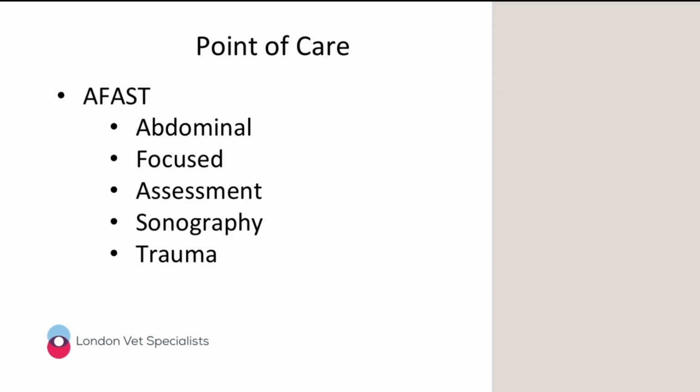So all of you in first opinion practice will be familiar with the AFAST examination, which stands for Abdominal Focused Assessment with Sonography for Trauma. This is an examination predominantly to look for fluid, and if there is fluid present, to try and make a decision as to whether or not you need to do anything about the fluid.